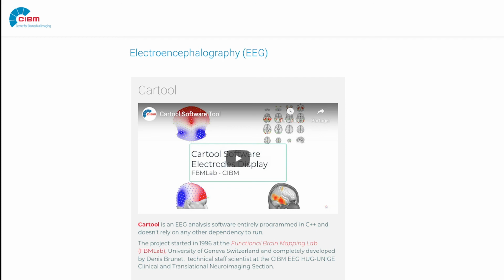Because if you ruin the left and right balance, then you also have a problem: if there are more solution points on one side of the brain, all the inverse solution will be on this side, of course. But other than that, yes, the user can plug in any solution points he or she wants. Right, thanks.